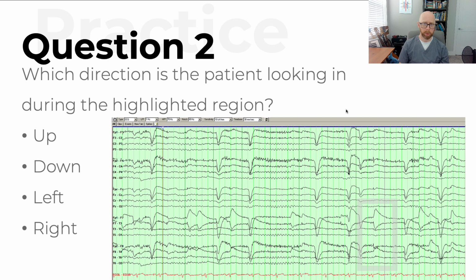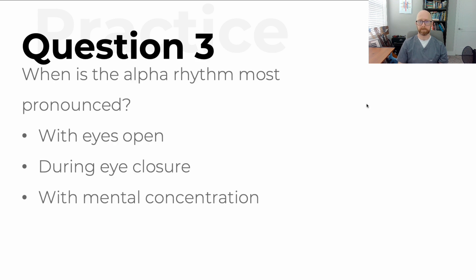Okay, question 2. Which direction is the patient looking during the highlighted region here in this picture? Remember, it's a positive polarity here and a negative polarity here. If you remember correctly, the patient here is looking left because they are looking towards the direction of the positive polarity.